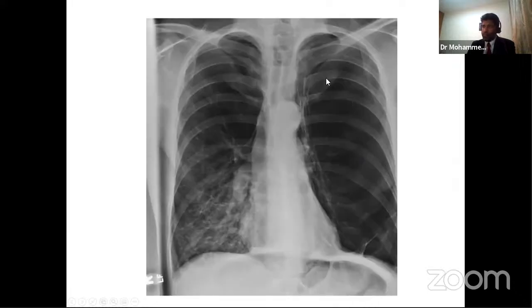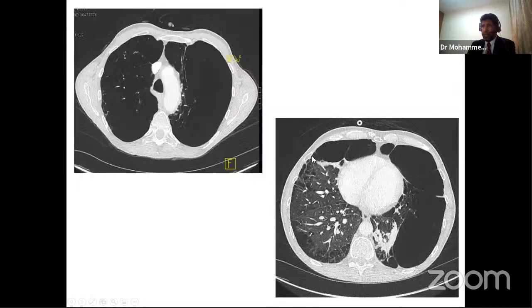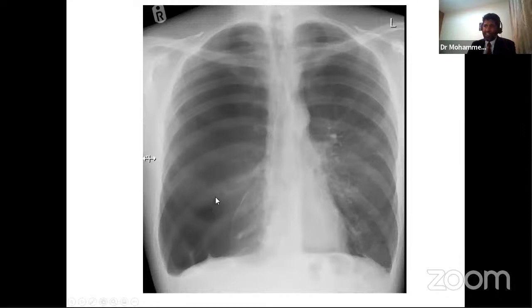This is another example of hardly any lung with some streaks there. This again is large, severe bullous disease, unlike the complete pneumothorax here with obviously paucity of lung markings, where the lung has gone down. This is just an example of paraseptal severe emphysema. This is almost a lungless disease. This is not a pneumothorax, but just severe emphysema. We can hardly see a few streaks there. This is a good example of how severe emphysema can present, and how it can be wrongly interpreted as a pneumothorax. Thank you.